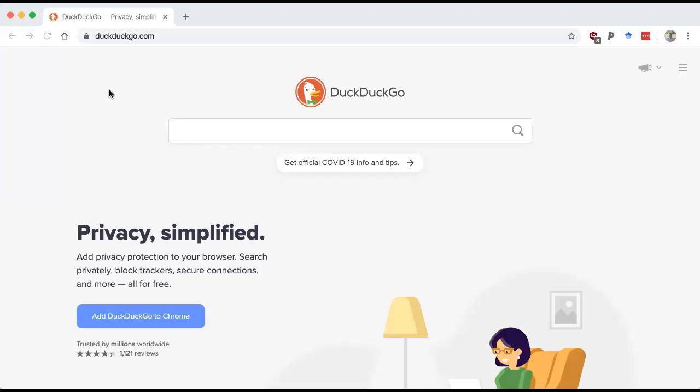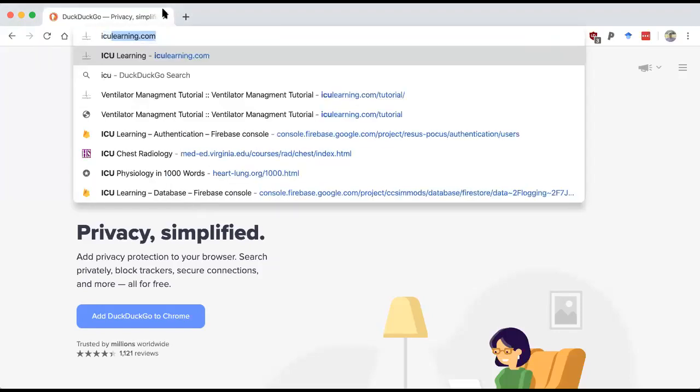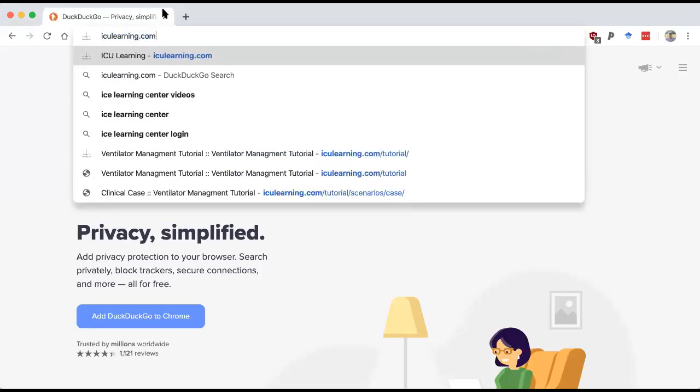Hi, in this video I would like to show you how to use the ventilator simulator tool available on the ICU Learning website. First, I go to the website iculearning.com.